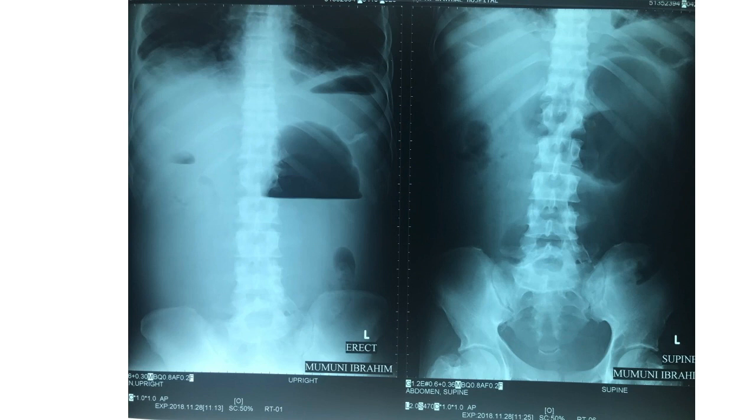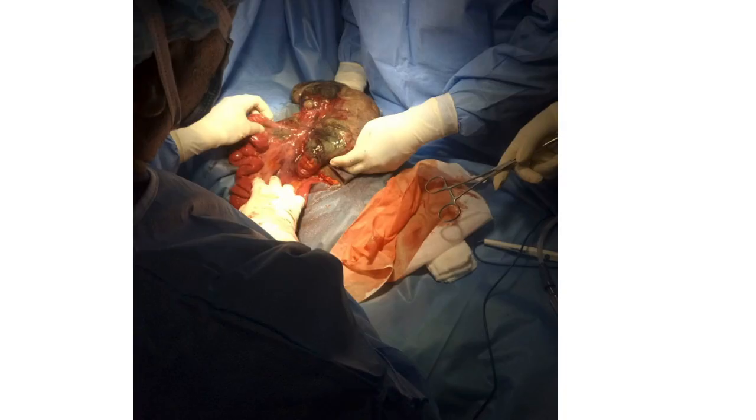This case came to our teaching hospital. So this patient had no pain. The patient was just feeling something after a meal and 1 beer. So to feel something, there is no huge distension, but the stomach was cramping. So you come to the hospital, we request this ultrasound. We see this kind of image in ultrasound, so we request the supine and erect position X-rays just to confirm the diagnosis.